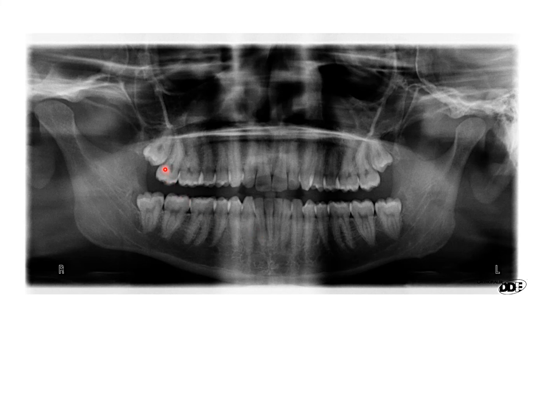So this patient presented with bilateral partially erupted maxillary third molars which showed signs of pericoronitis bilaterally, and looking at the OPG, the root apices of both the maxillary third molars seemed fairly straightforward, conical, and no accessory roots were identified on either side. You cannot note any signs of dilaceration, etc.